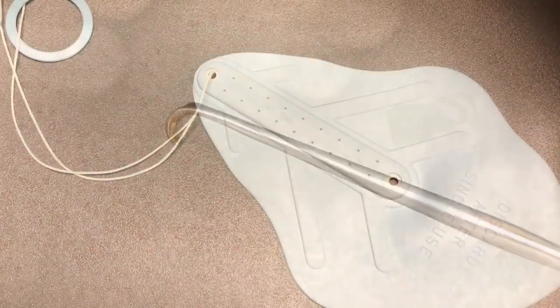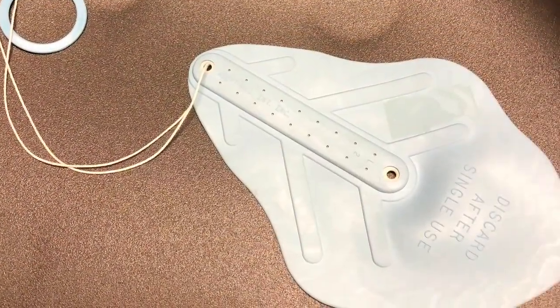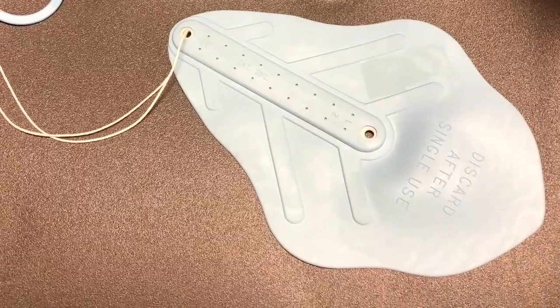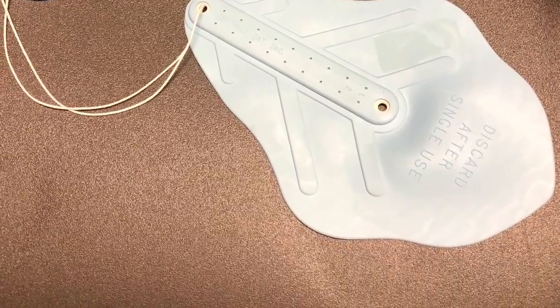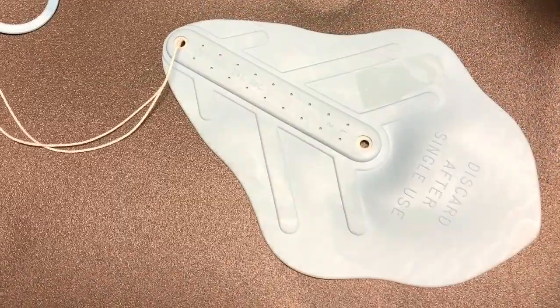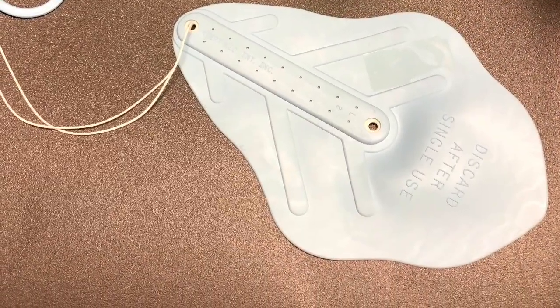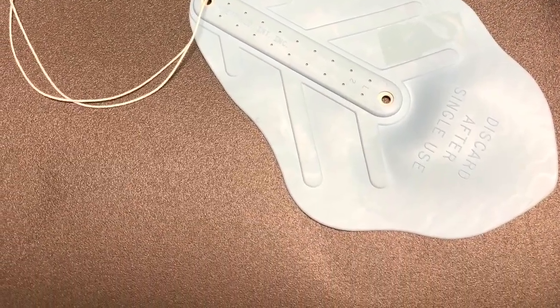The Fish abdominal wall retractor. This flat disposable retractor allows for compression during abdominal closure. It retains the omentum and visceral layers of the peritoneal or abdominal cavity during closure. There's an attached string and ring to decrease the chance of retained surgical objects.